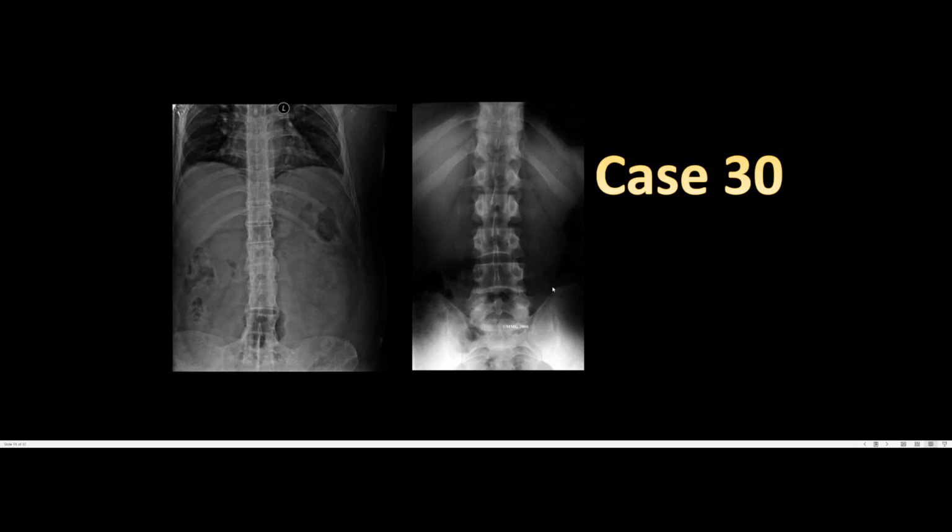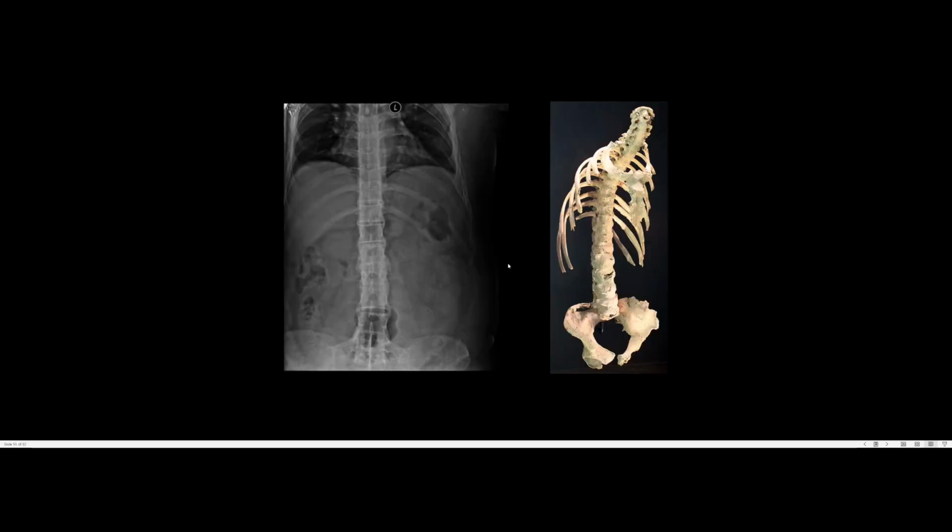Now, let's look at case number 30. Case number 30 suggests to you a case of bamboo spine. If you have multiple vertebral bodies with very little intervertebral space, you can think of it as a case of bamboo spine, and bamboo spine oftentimes occurs due to ankylosing spondylitis, for example. So this is case number 30, an orthopedic case. Well, this case doesn't have much of an issue. And if we look at case number 31, again, it showcases the bamboo spine, where there's destruction of the intervertebral spaces. All right, so that's pretty much it for the bamboo spine.